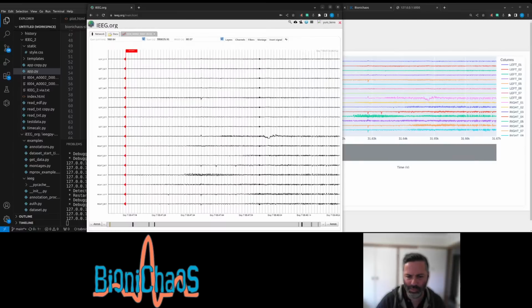Yeah, this interface is a bit odd. Right, so this is right of 1. Then we have right of 2. This red one with 2 notches is right of 4. That's correct.